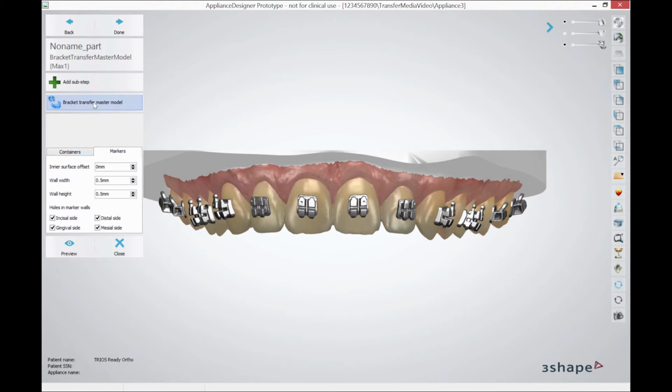And then here under markers are the various options we can tweak. I'll make a version for us to evaluate while we discuss the various production parameters.